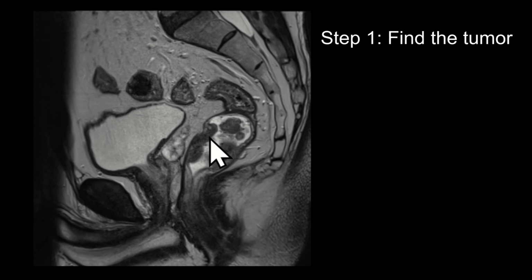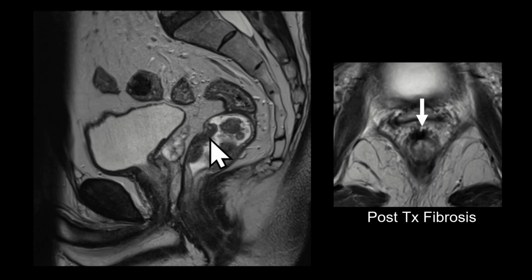Then, if you know the anatomy that we already covered and can identify tumor signal, the rest of staging is just defining its extent, i.e. which structures are involved. When restaging tumors, the principles are similar, but you need to try and differentiate post-treatment change and residual viable tumor. So typically, post-treatment fibrosis is going to be very T2 hypointense and will not restrict diffusion, unlike residual tumor.